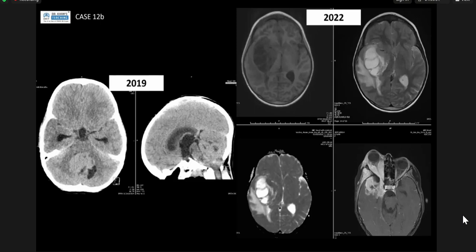So, the others do have metastases down the CSF, so like neuromets, but then it's just an interesting case because you take note of the timeline. If you hadn't gotten that this was some sort of brain tumor, because I think it looks fairly aggressive, right? Because you've got your hydrocephalus there as well. And again, posterior fossa, you would think brain tumors first. And then if you start to see that 2022, why have things changed? And things do look fairly aggressive, with cystic components, although I didn't give you the full slices.